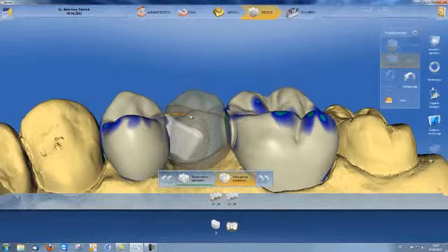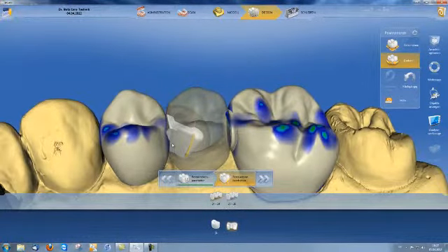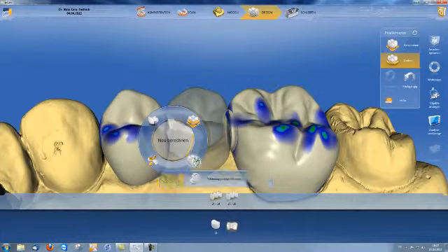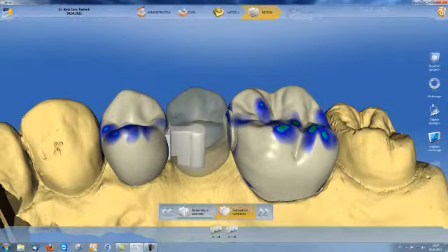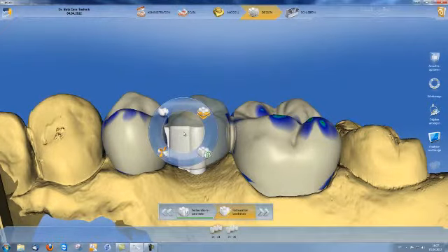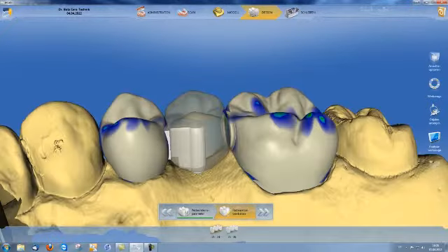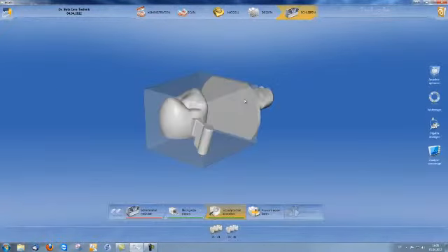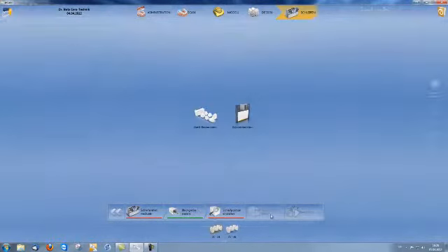If the attachment is completely displaced, i.e. it is out of my telescope angle, I can activate Recalculate with a right-click, and this is recalculated in the first proposal. I then activate Create Matrix and can mill out my divided attachment in the milling preview, or alternatively export it in order to mill it using the Stack software, or to save it as an Infinident file.